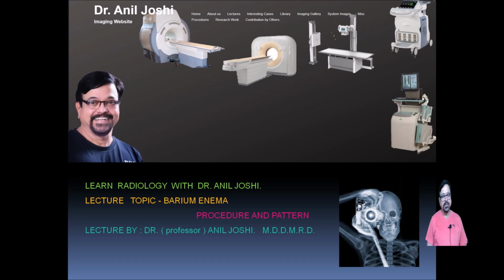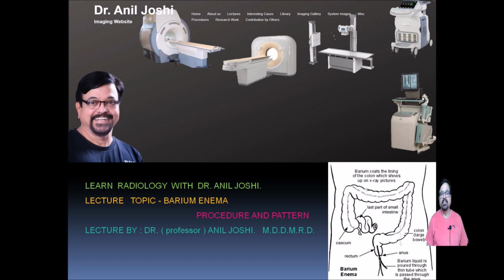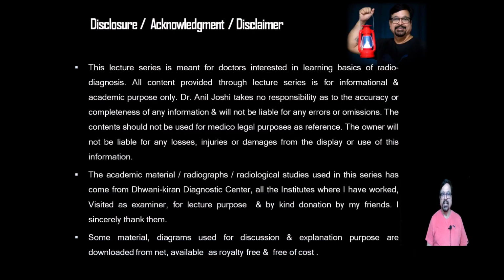Today's lecture topic is based on the barium enema study. We are going to see how a barium enema is done, what the procedure details are, and how to interpret the pathologies. We are also going to see which pathologies can be interpreted with the help of barium enema. Now let's get started.